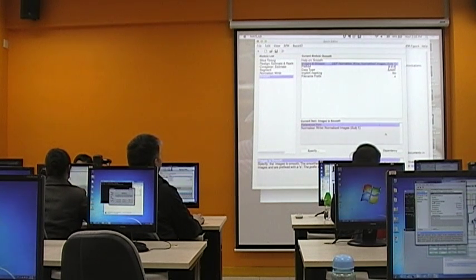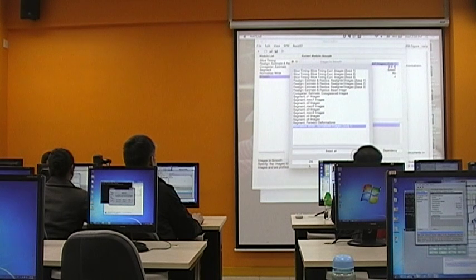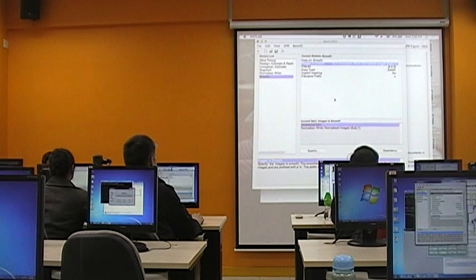So you are using dependency, getting the output from the last step, and then you just need to decide which files as an input, because now you have written out the normalized EPI images, the normalized functional images. So you simply choose under dependency the normalized. So you are smoothing all these normalized functional images here.